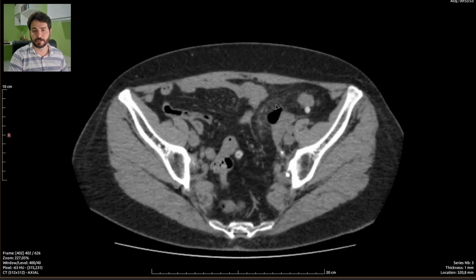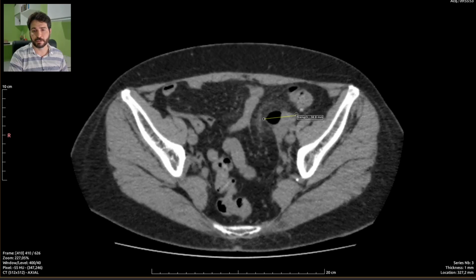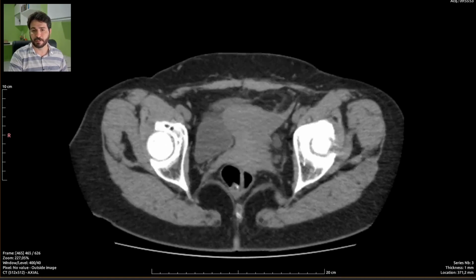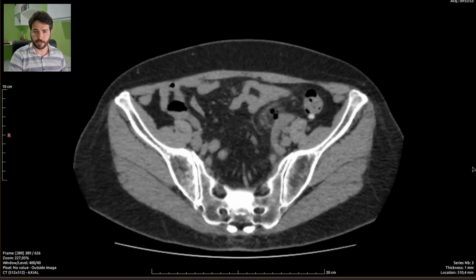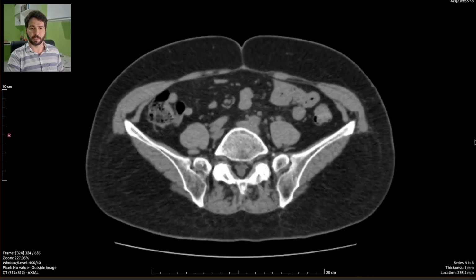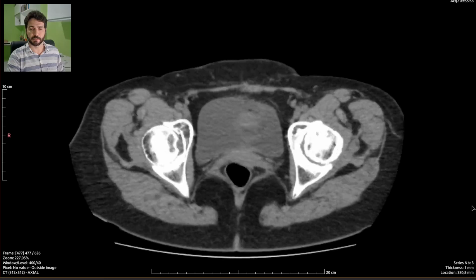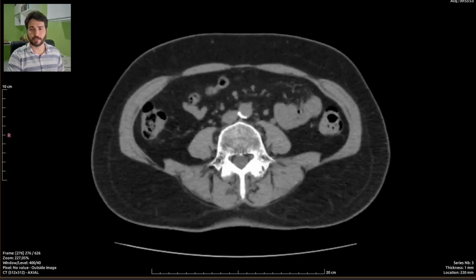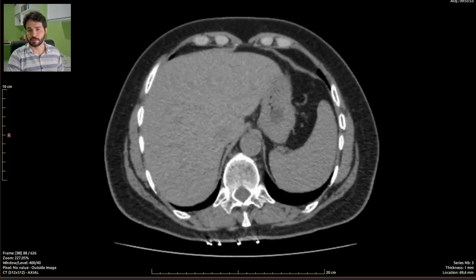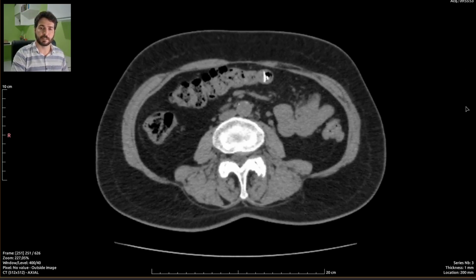But I'm going to consider this entire image right here a gas fluid collection, thus an intracavitary abscess. So this is just what we expect for a complicated, at least moderate, acute diverticulitis of the sigmoid colon, and it matches precisely the complaints of the patient.